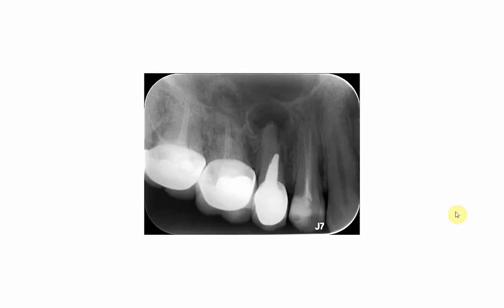In this radiograph you will see that we have overlapping of the margins. Can you see here, over here? This is overlap, this is overlap. However, this is the only good part of the radiograph that has been done. So here there is a failure in directing the cone in a horizontal angulation.